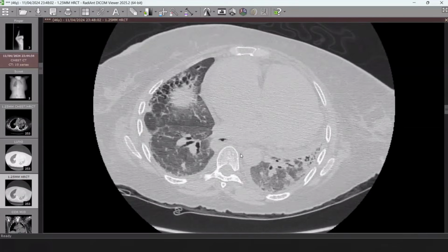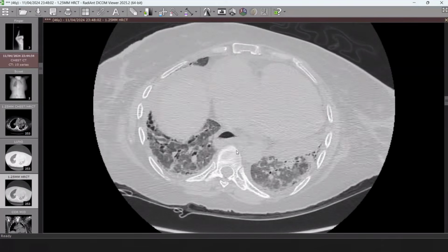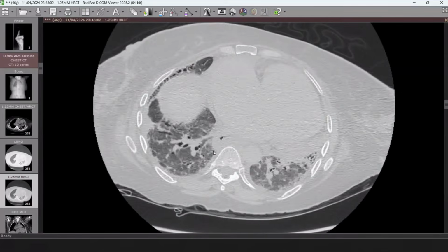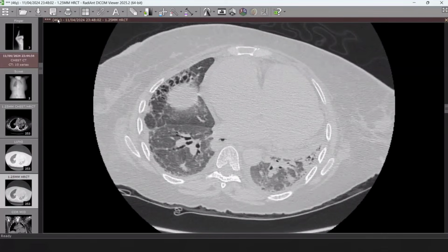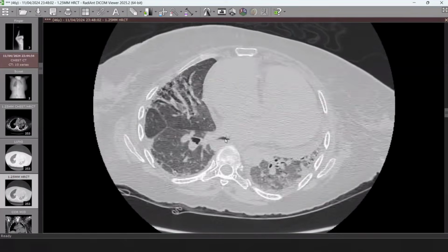And scleroderma, by the way, 70% of the associated interstitial lung disease will be NSIP, not UIP. UIP in 30%. So we have different points, interstitial changes keeping with UIP, but the age of the patient, I think 46 years old, is younger, with a dilated esophagus and scleroderma.